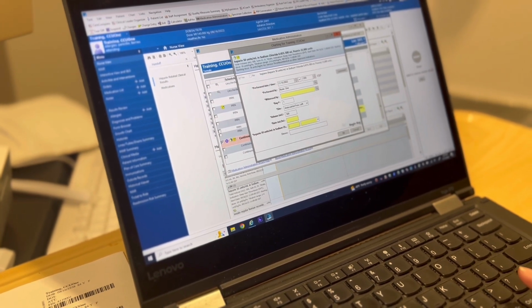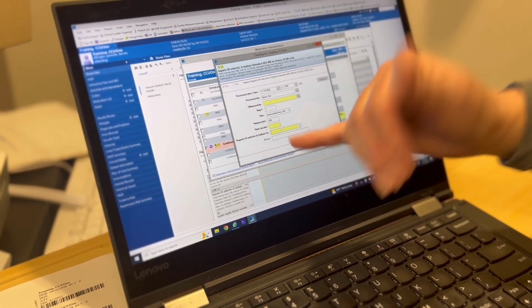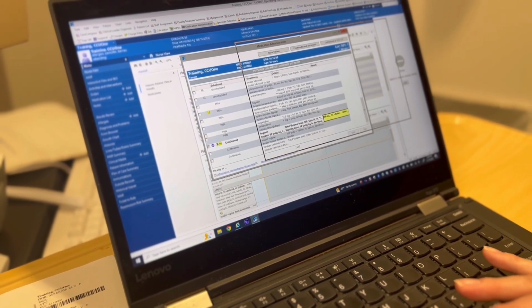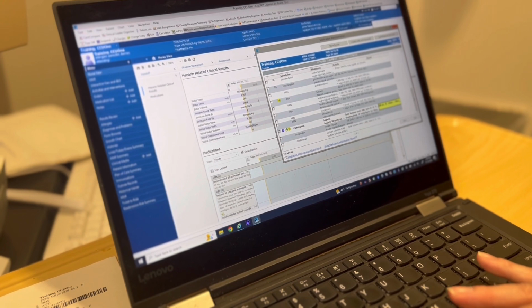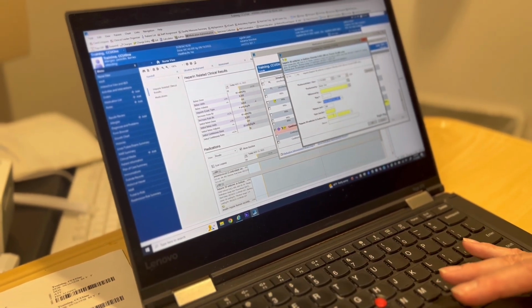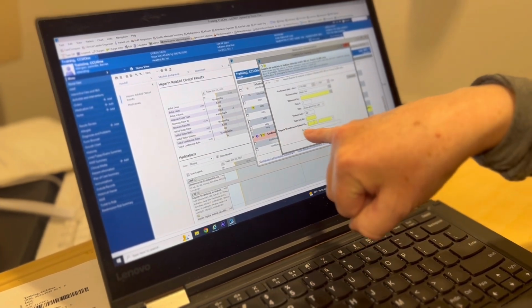And this is a problem that you might come up to. I'm not going to go by memory, so I'm going to cancel that out. I'm going to have to move this box over so that I can see these numbers. Now click the yellow again. So now when I click here, see it says my heparin.